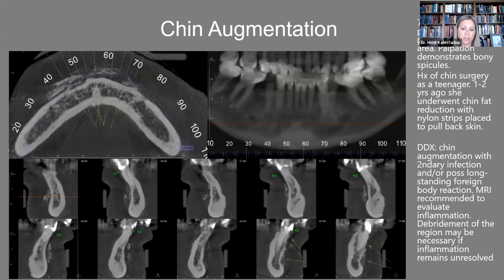Obviously, she's had it for 50, 60 years and had no issue, but this is something that is new. And so for us, we would start to think, okay, she probably had some sort of procedure, and then we have a secondary infection. So we have introduced some sort of secondary infection into the area, which can happen with that.